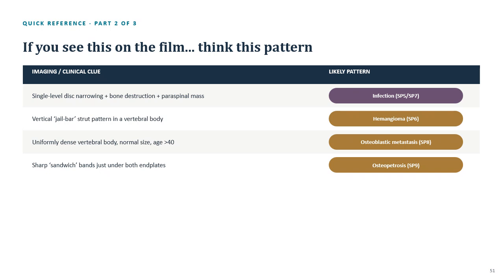So again, that has to be a combination in terms of finding out what is happening with the patient. If the vertebral body has thick vertical lines running through it, sometimes we describe that as a jail bar appearance. So jail bars, if you've looked at TV, someone in jail, sometimes you see them behind the bars.